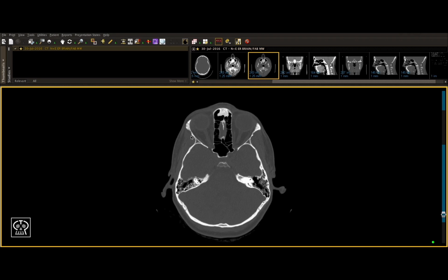In addition, if you go more superiorly, you'll be able to see the connection between the zygoma and the frontal bone, or the suture line here. This is your ZF suture area. It'll become more obvious when we see demonstrations of fractures how these areas can be displaced, but those are the 4 suture lines you always want to check when doing your approach.